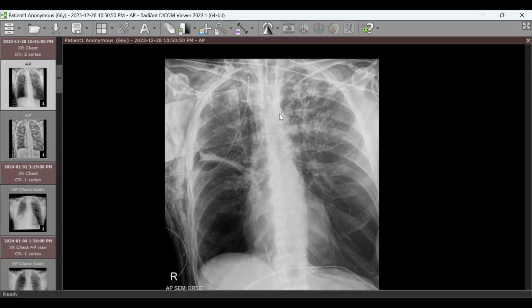So it's not higher, not lower, so that it is open to the coronary sinus, the opening of it. Yeah, the coronary sinus is on the left side. That's when we have a double, but not like in normal anatomy.